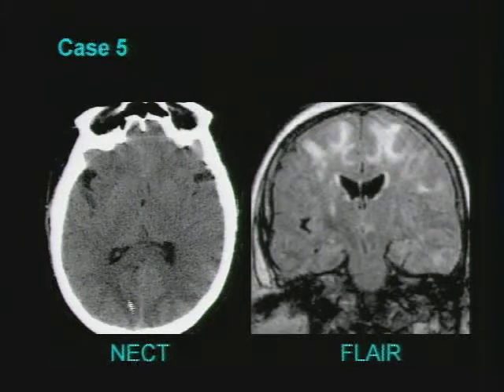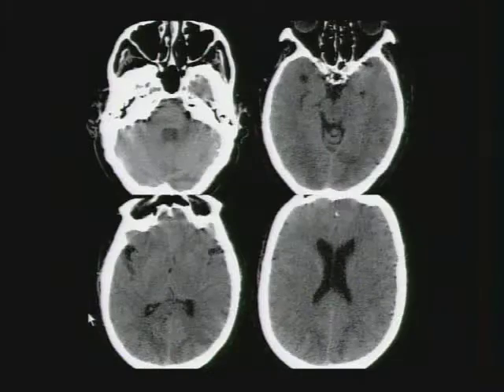And you can really see it subtly on the CT. It is there, but again, I'm not surprised when people miss this on CT. Here's the rest of her CT, and if you look at this now, you can see this here. This is bilateral occipital and parietal low density involving the subcortical white matter in this patient.